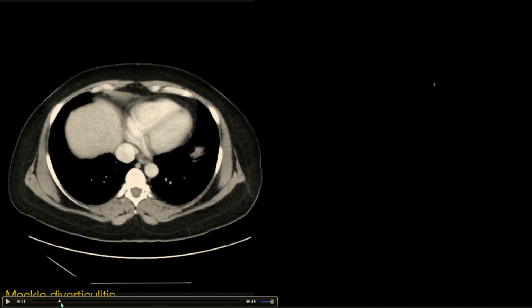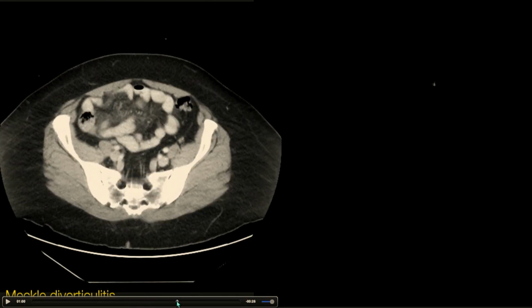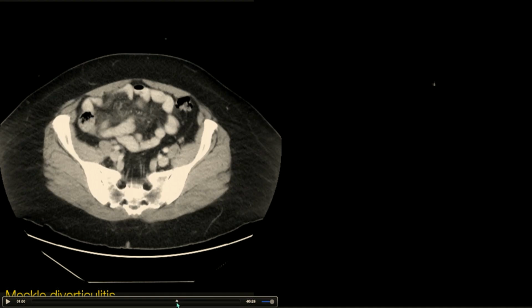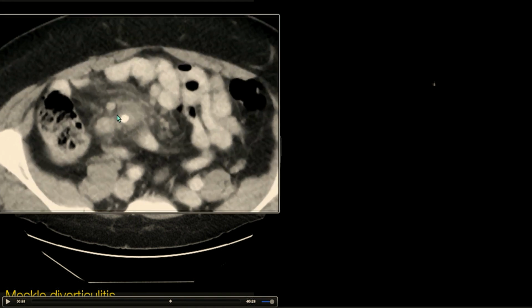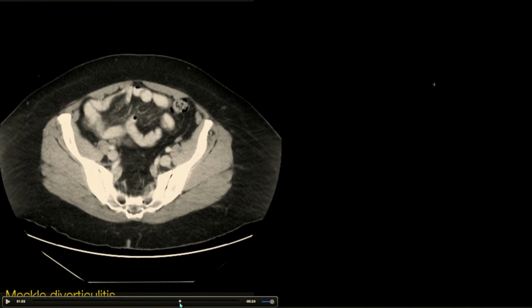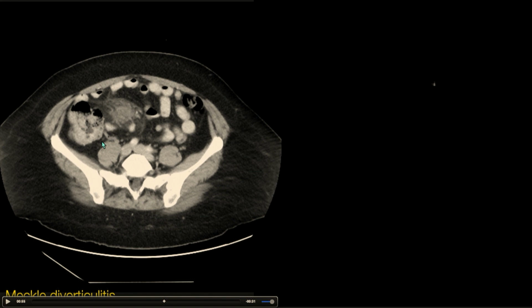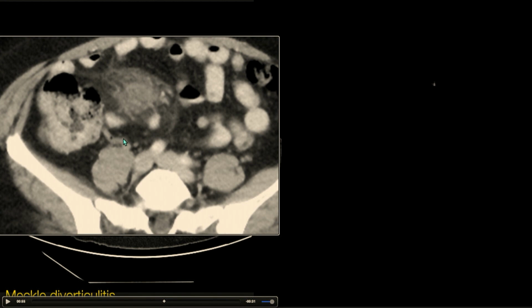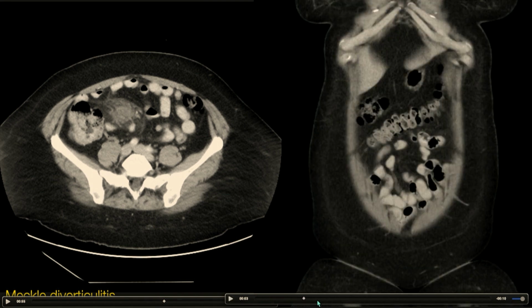All right, as we work our way down, rounding out diverticular disease, and we're getting to the right lower quadrant. Here is what looks like a perforated appendix, right? It looks like it could be coming from the cecal base. We're coming up, and there's even a couple of liths here and some inflammation surrounding it. But as we scroll a little bit more, actually up a little bit more, excuse me, we find the appendix coming off normal, separate from that structure. So a normal appendix is going to be the key to making this diagnosis, as it can often mimic appendicitis.